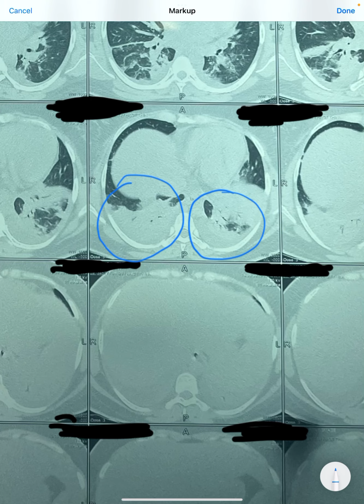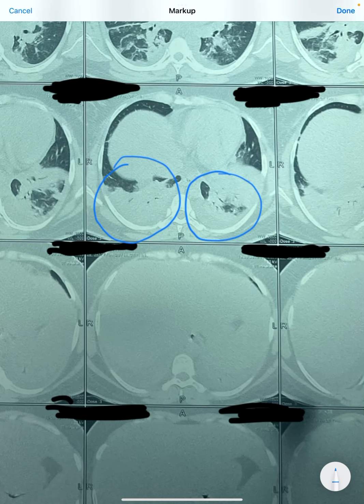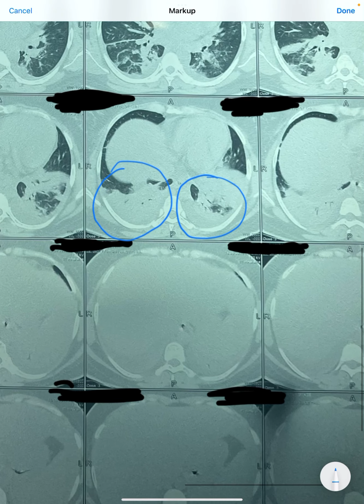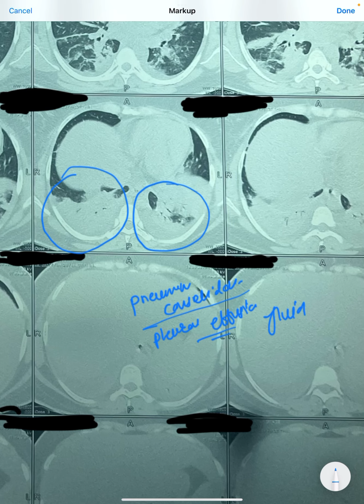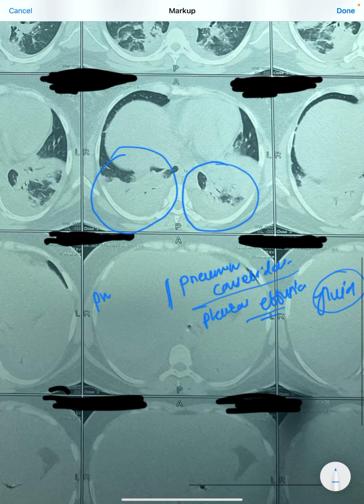Whether there is consolidation or effusion, there can be this one small confusion. To find it out, if it is pleural effusion, that will be more homogeneous. It will be like a white out. If you look very closely, such hyperdensity can be because of pneumonia or consolidation, or because of pleural effusion. Pleural effusion, as we know, is a collection of fluid. It is a collection of pleural fluid, and consolidation is a collection of protein-rich exudates in alveoli.